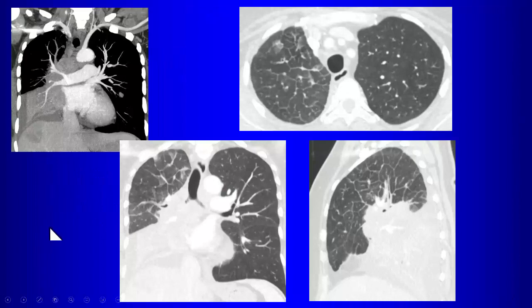In the same patient, this patient has this interlobular septal thickening here in the right upper lobe. What do we attribute that to? What would you attribute that to? Venous congestion. So certainly when we see interlobular septal thickening in cases of neoplasm, one thing we always consider is what? Well, what do we call that? Yeah, lymphangitic carcinomatosis, right? So that's something we consider.